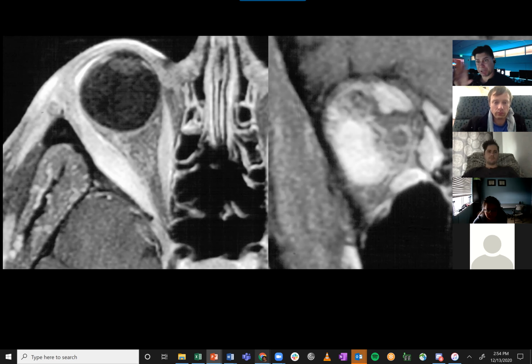So what if I told you that this happened relatively quickly and it hurts a lot? Then I'm thinking more infectious inflammatory, like pseudotumor. Pseudotumor, IOID, idiopathic orbital inflammatory disease, that hurts. That's right. So this is a good example of that. Now there is a differential here. You can have metastatic disease to the eyeball, and there's IgG4 and other weird things that may happen. But if this hurts and you have proptosis, we think about pseudotumor because pseudotumor hurts. That's right. Good job. Okay, next.